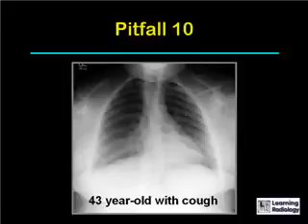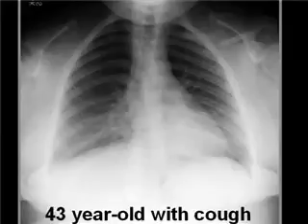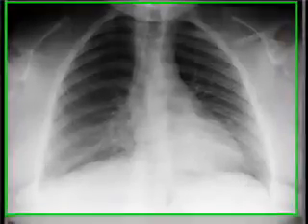And here's the last pitfall. This is a 43-year-old with a cough. This is a frontal image from a chest series. What do you think?